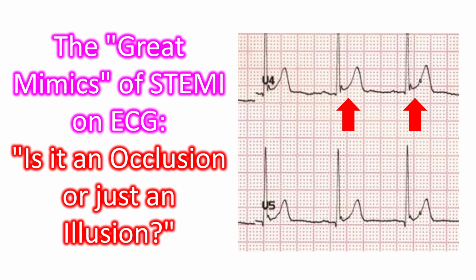Imagine that you are in the emergency room. The monitor alarms. You see ST segment elevation in the precordial leads. Your first instinct? Activate the cath lab? But wait. If you call this a STEMI, you might be sending a patient with pericarditis for an unnecessary procedure, or worse, missing a life-threatening electrolyte imbalance.